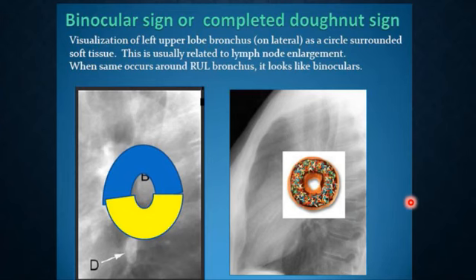The binocular sign or the completed donut sign, you know the donut? You see this, they call it a bagel.